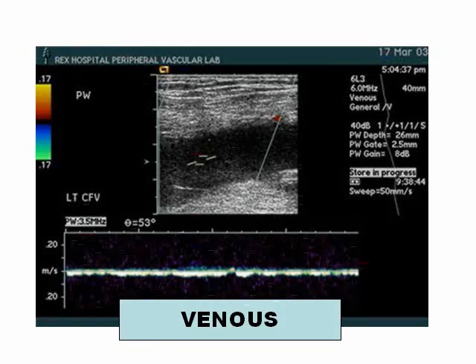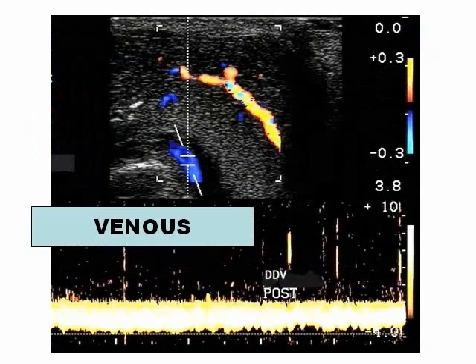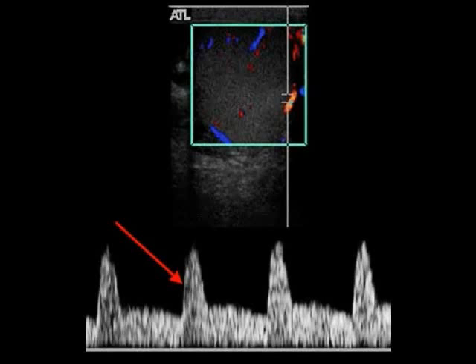And this is a venous flow that has no pulse because it's the flow returning to the heart. Other venous flow here. And this is an arterial flow, a low resistance arterial flow. I think it is a hepatic artery that has a very high diastolic flow. This is a low resistance flow.